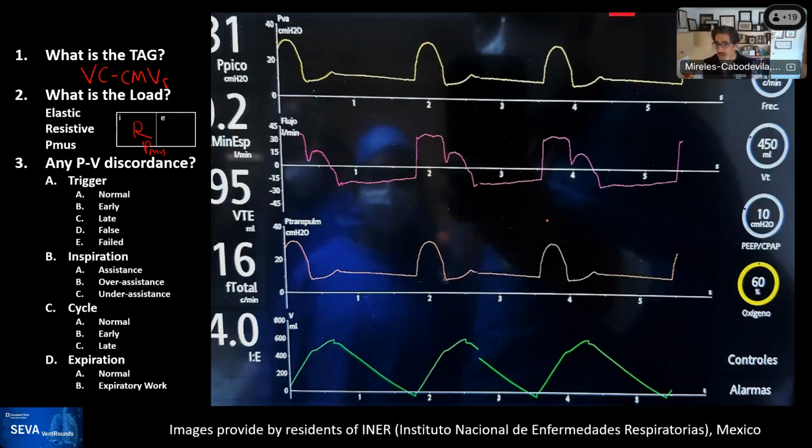And the next one is that if you look at the expiratory phase, it doesn't look pretty at all. There is not even a peak flow, which is a feature of issues. And then there is no exponential decay. If anything, it may be consistent with expiratory effort or increased resistance.